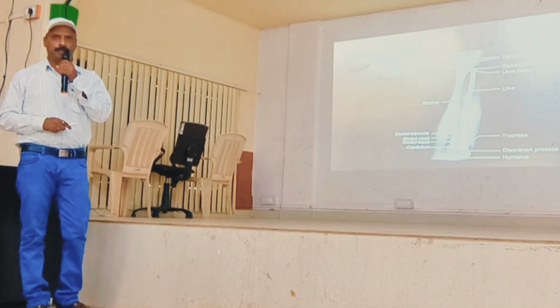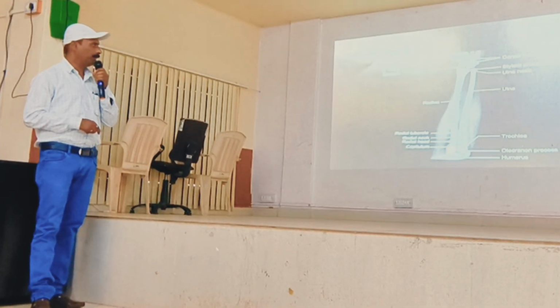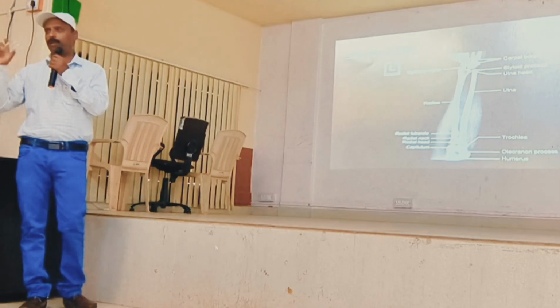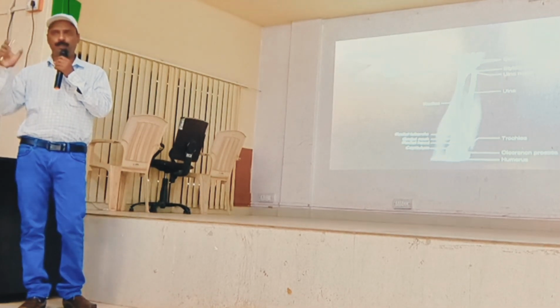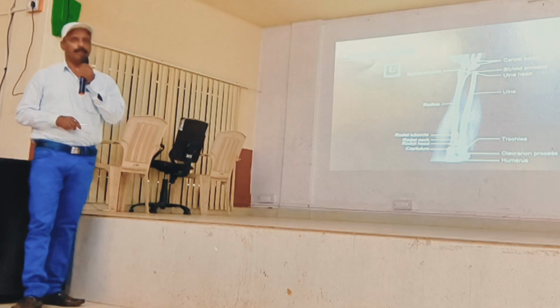That is what you have to see, and the other parts seen in the X-ray: the lower end of the humerus, the total elbow joint structure, the wrist joint structure, and the radius and ulna. So these are all the AP view of the forearm, highlighting the elbow and wrist. This is the forearm plain X-ray.